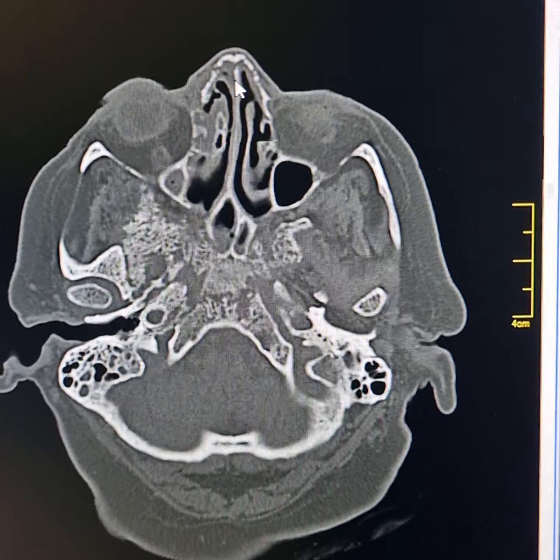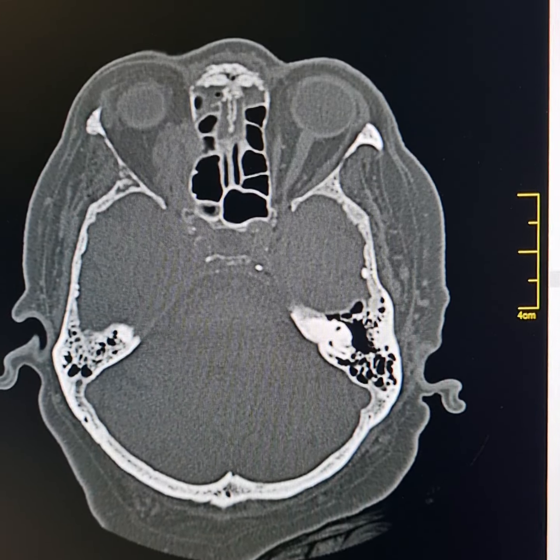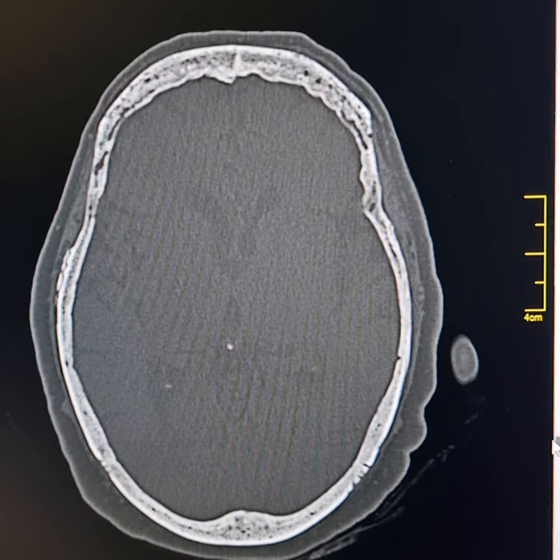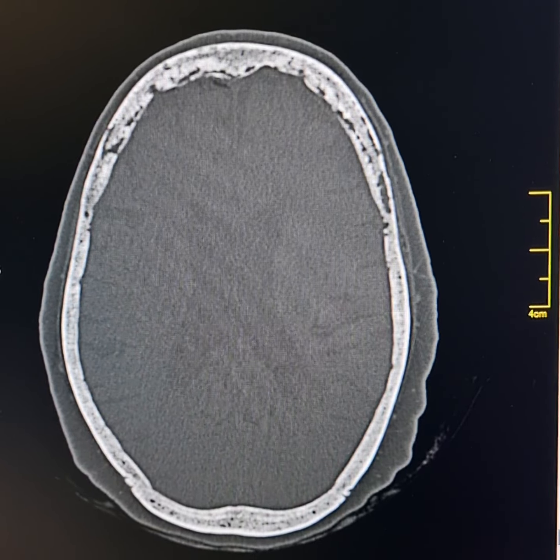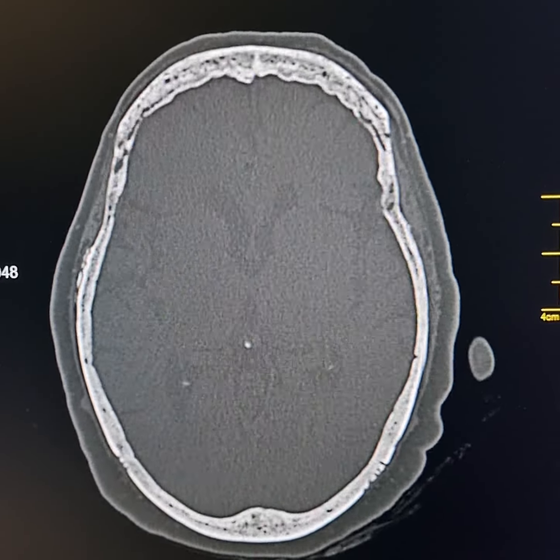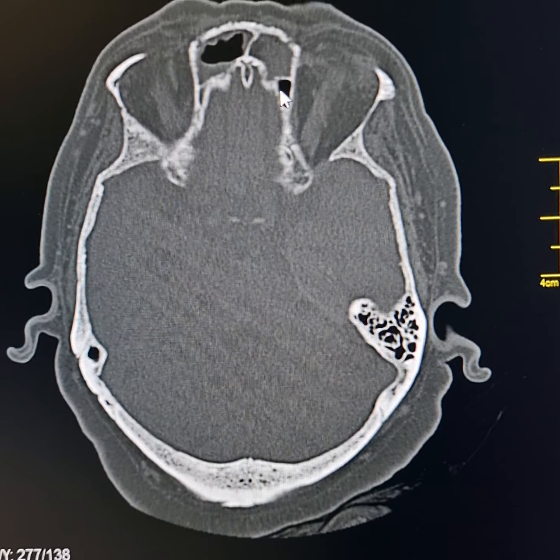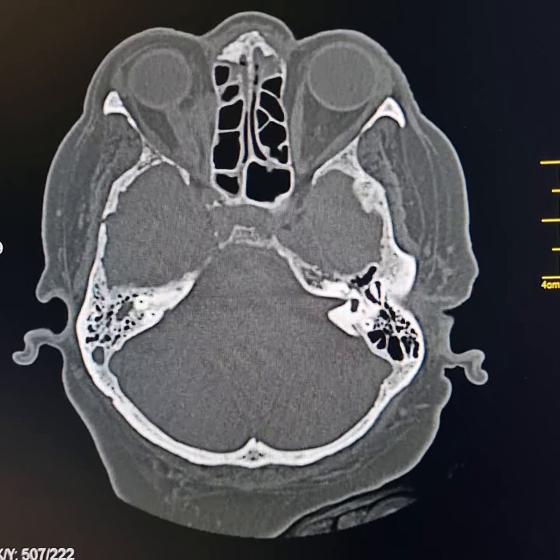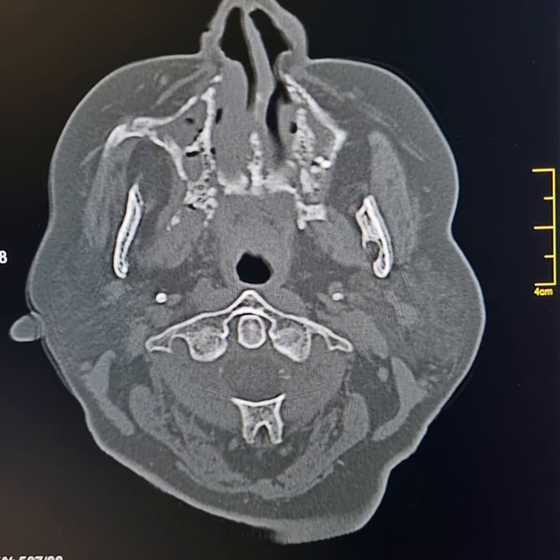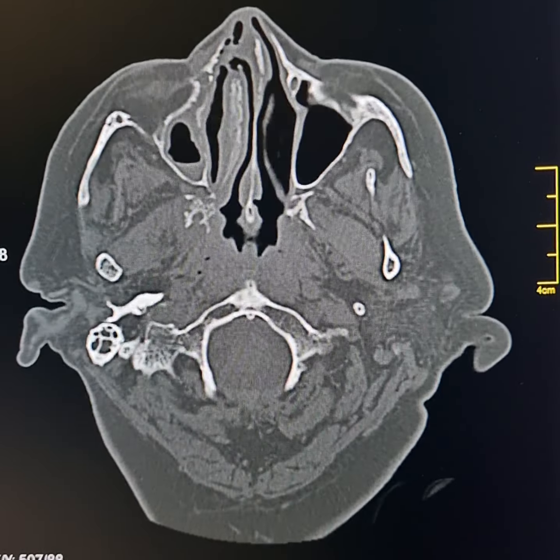Erosive process extends upwards to involve both the nasal bones and the visible parts of the frontal bone. I go back. All the walls of the frontal sinuses are eroded. Mucosal thickenings are seen in all of the paranasal sinuses. These are suggestive of pansinusitis.